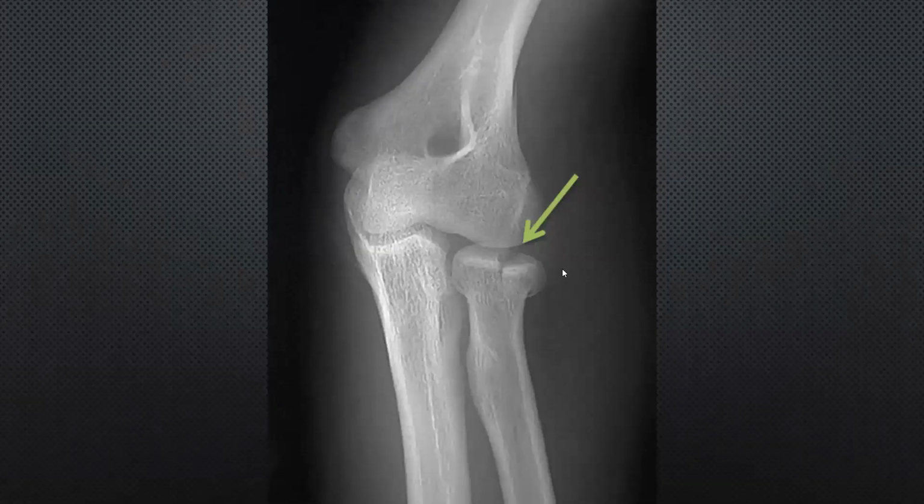What about the problem here? Radial head fracture. Depressed, right? Yes. What about joint congruity? Is the joint congruity affected here? Yes, very wide, right? But here it is normal, normal, normal.